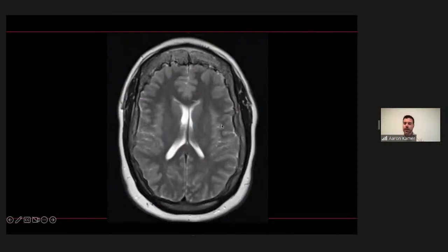All right. Let's see. Who else should I pick on? Dan, can you tell me what you see on this image?